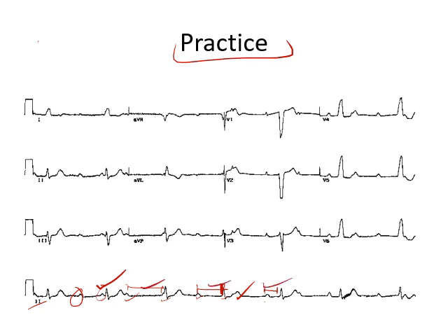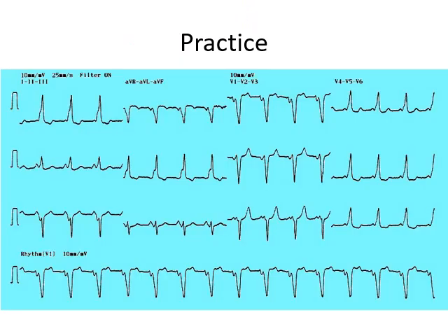So can you guys remind me of a condition in which PR interval is changing? It is complete heart block. Let's interpret this one ECG before moving to the next area.